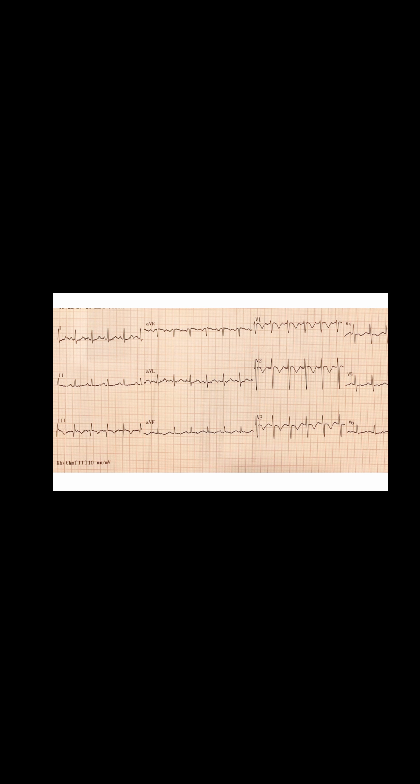So, what things suggest that he might be having pulmonary embolism? First of all, if you look at lead 3, you will see that this here is Q3T3 pattern with sinus tachycardia, more commonly seen in pulmonary embolism. While when you look at the precordial, specifically anterior leads, there is T wave inversion with prominent R wave in lead V2 here.